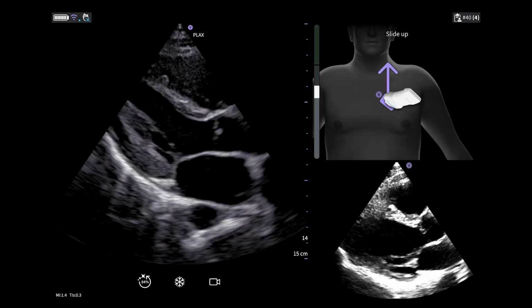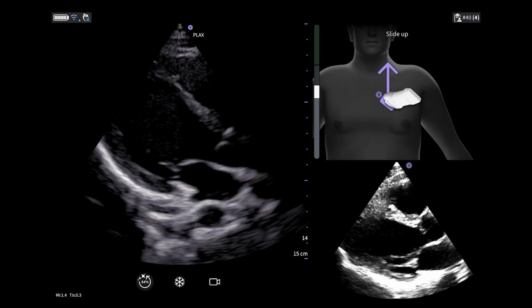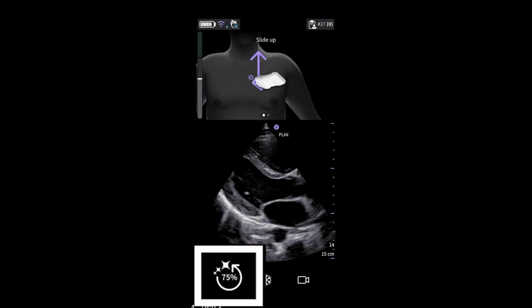If you opt to use Save Best Clip, the same purple box will move across the screen to indicate that your best 2-second clip has been saved in the image gallery. Here's how the Save Best Clip feature looks on the phone.